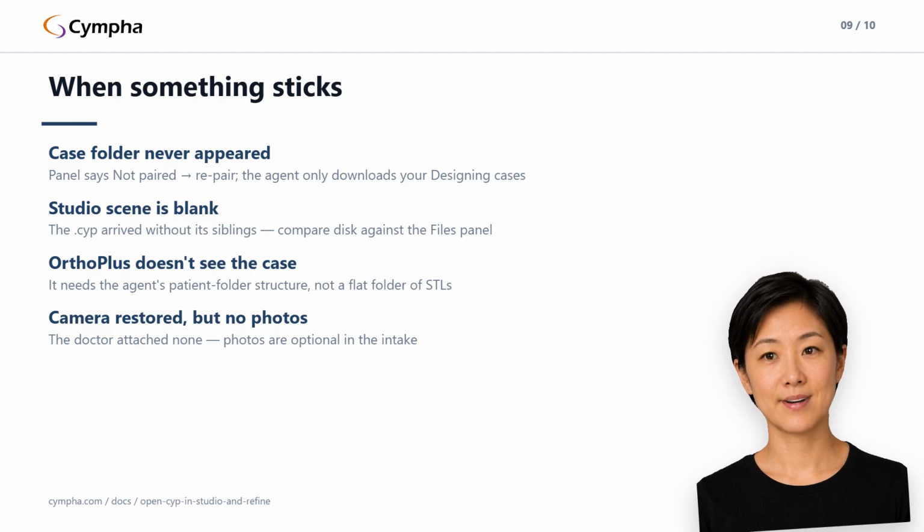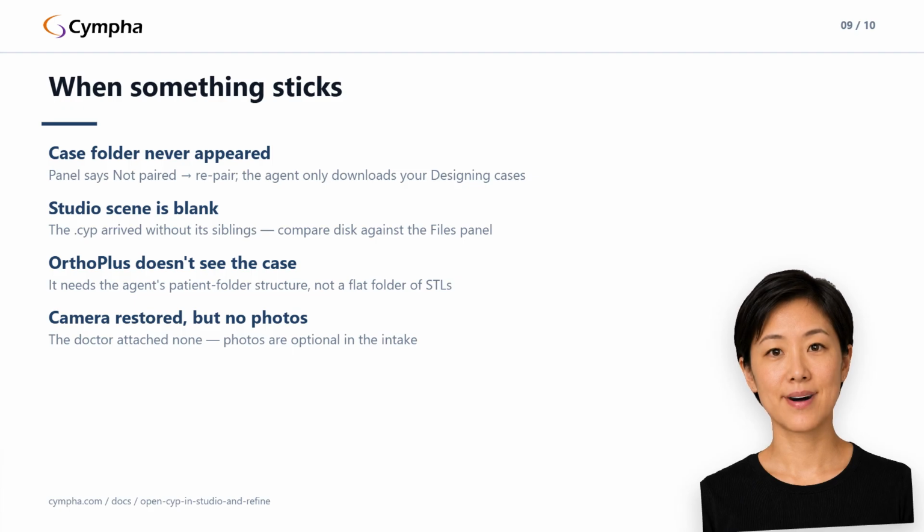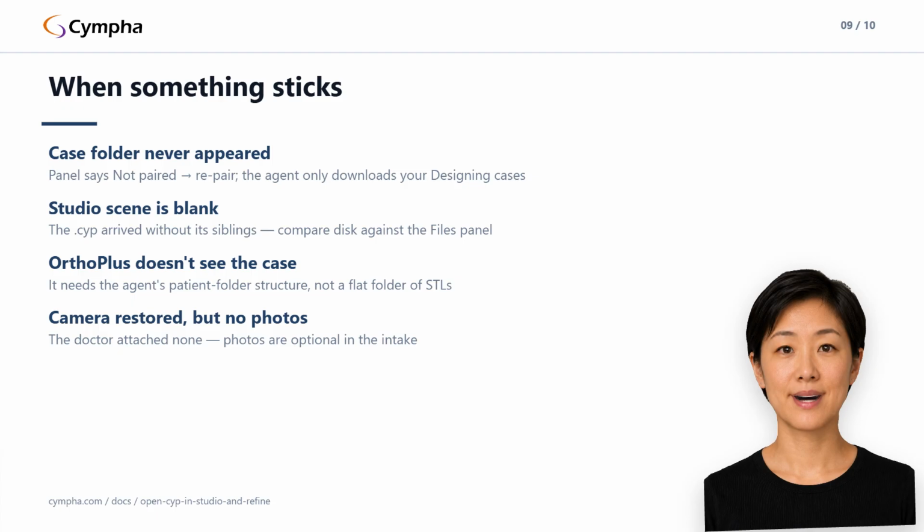It needs the patient folder structure the agent creates. Pointing it at a flat folder of STL files won't trigger the case-aware flow, so verify the subfolder name matches the patient date case pattern.